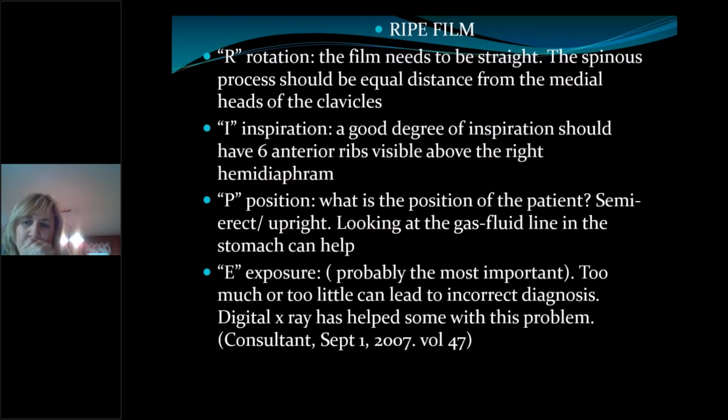One of the things to know if you got a good film or not is an old article written in Consultant years ago, and it still holds true, is RIPE, R-I-P-E. And RIPE is a nice little acronym that stands for, R is for rotation. Basically, the spinous processes need to be equal distance from the medial heads of the clavicles, and I'll show you that in English. It'll make a lot more sense. Inspiration is important, that when the patient does it, did they listen to the tech correctly and hold their breath, and making sure that it's an appropriate study.